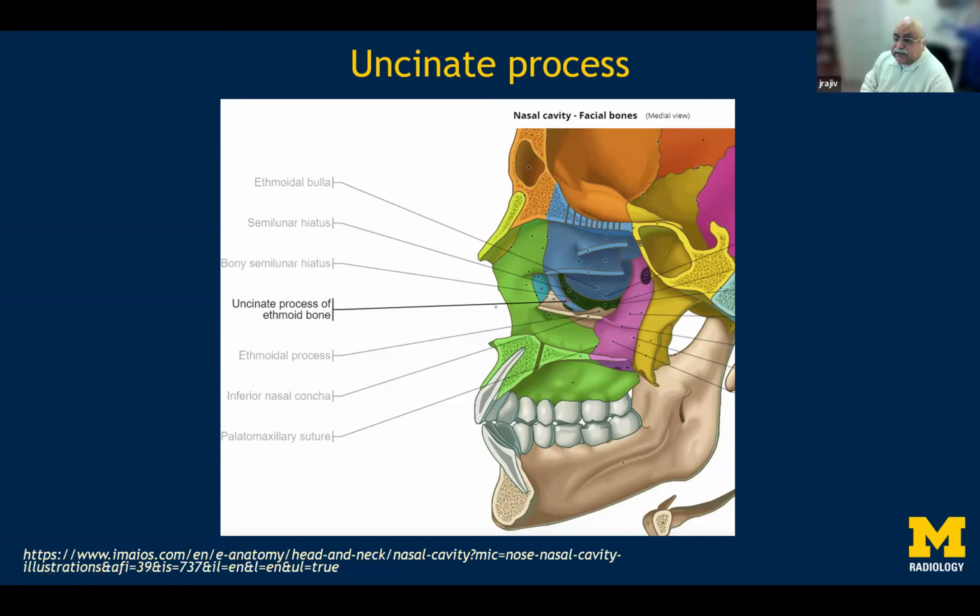So that's one of the first steps we do when we are looking at relieving the obstruction to the maxillary sinus.